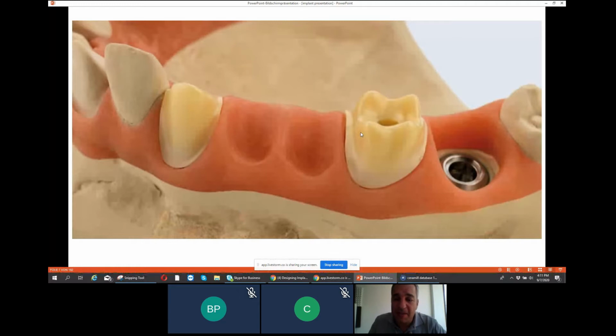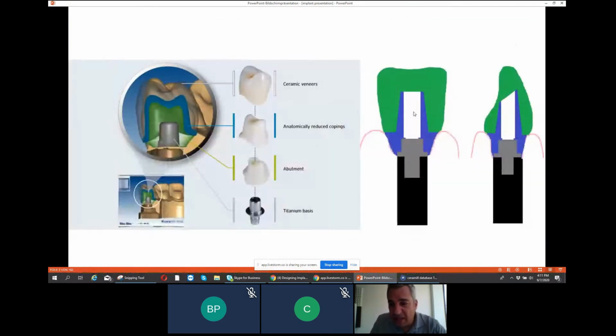We call it abutment plus crown. It means we will create the abutments and then we create a bridge that we cement over these abutments. About this technique, as you can see in the picture, we have the implant in black, titanium connection, titanium base, Ti-bond, we call it, sorry, Ti-connect for single restoration in gray. We have the abutment in blue and the final restoration can be in green.